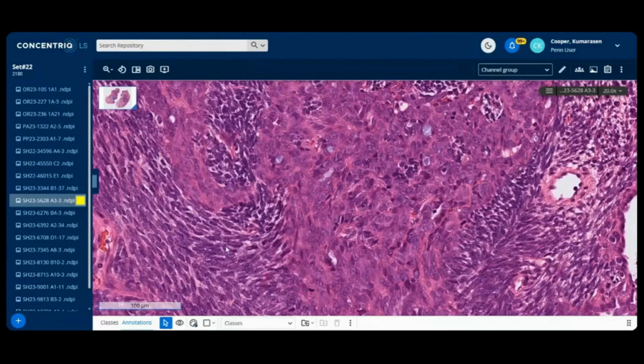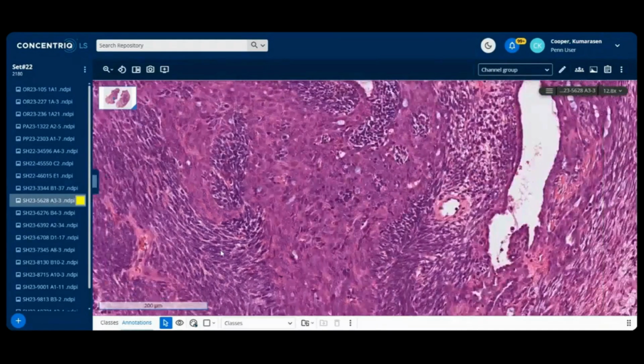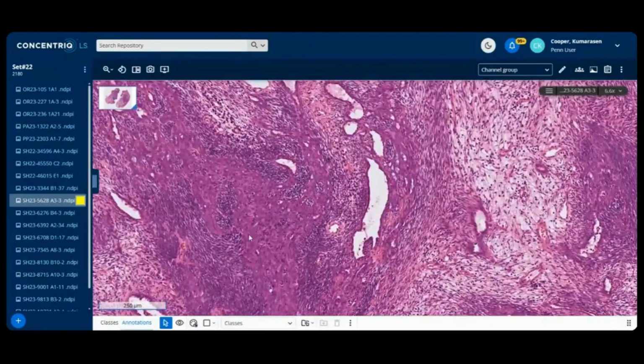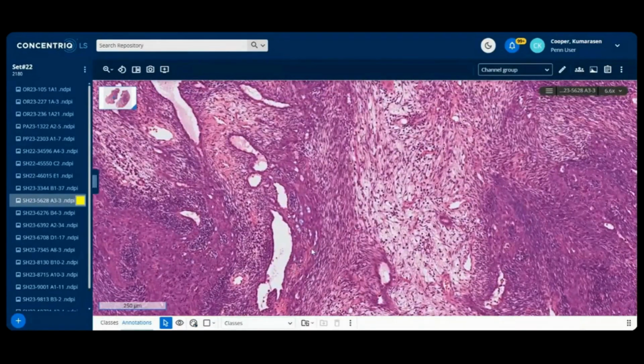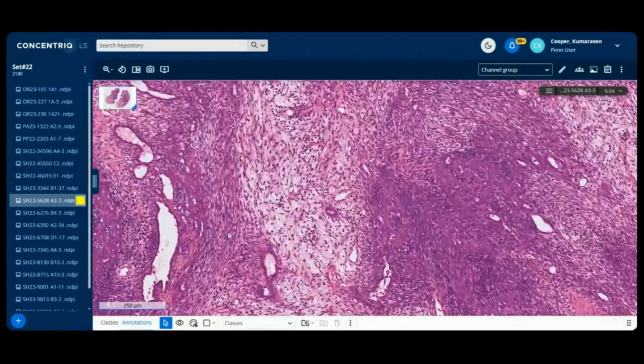So those are sort of differential diagnoses that you would think about. This is biphasic. The EMA keratin would highlight it, and if you have TLE1, whose specificity is not that great, you could do that as well. But I would not make a primary diagnosis based purely on TLE1. I'd use the morphology, EMA keratin, noting that those are very focal and positive as well. But I would do the FISH analysis for SYT, SS18, which was positive in this.